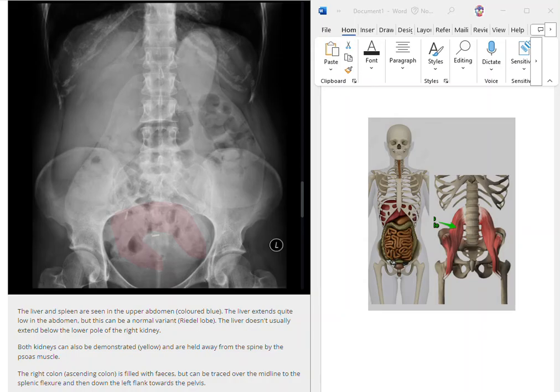We've got small intestines, large intestines, kidneys hidden behind there, a stomach, a liver. We've got a lot of soft tissue, fatty tissue, more muscle, ligaments, integumentary system. We have all of those things superimposing those psoas muscles.